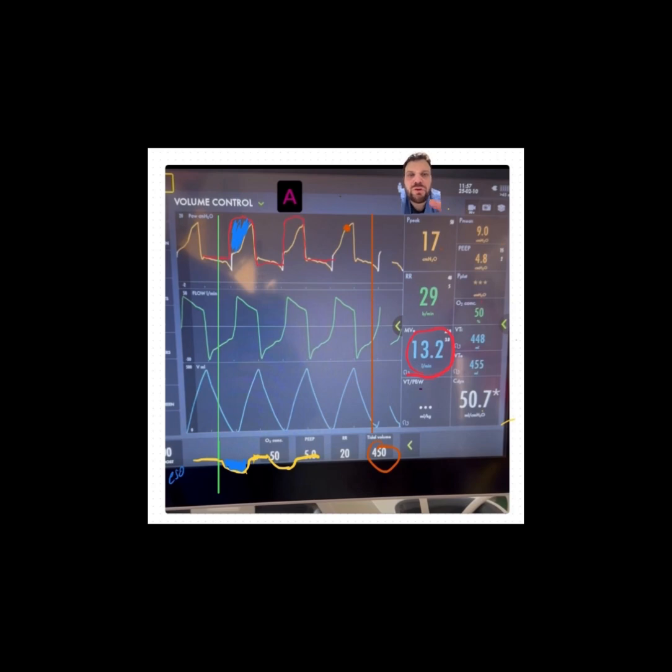So just going to go over the post I made yesterday. So this is essentially how I found the patient. Now, remember, when I approach significant asynchrony, I tend to try to visualize what the breath should look like and then what it actually looks like. So what it should look like is what I drew in red.